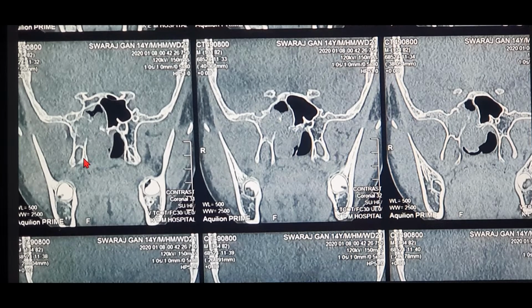Now, the epicenter, the origin may be the superior lip of the sphenopalatine foramen, but the origin of the JNA, the epicenter of the JNA, is the so-called pterygoid wedge or the pterygoid body. That's the center of the pterygoid body called as the pterygoid wedge.